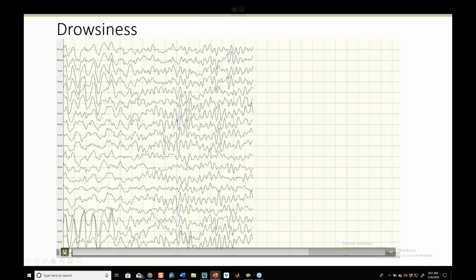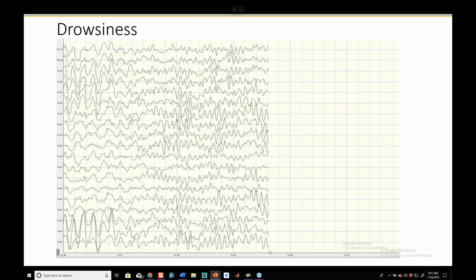Yeah. So I'm going to hit pause here. This combo is what's called a K complex. K stands for knock, because if you were to knock at this point in the recording, this person would not awaken because they have sleep spindles, which is a stabilizing mechanism of sleep. That's one of the reasons why one way to train sleep is to enhance the presence of beta 1 or SMR.